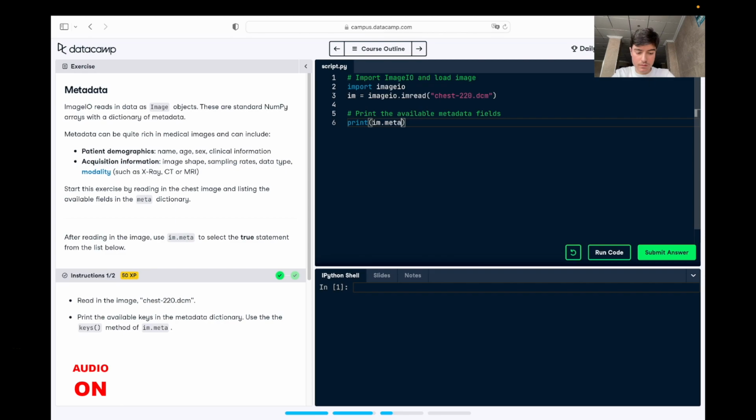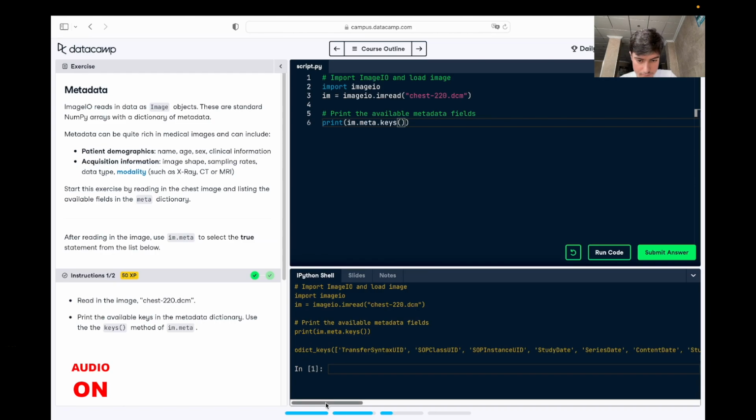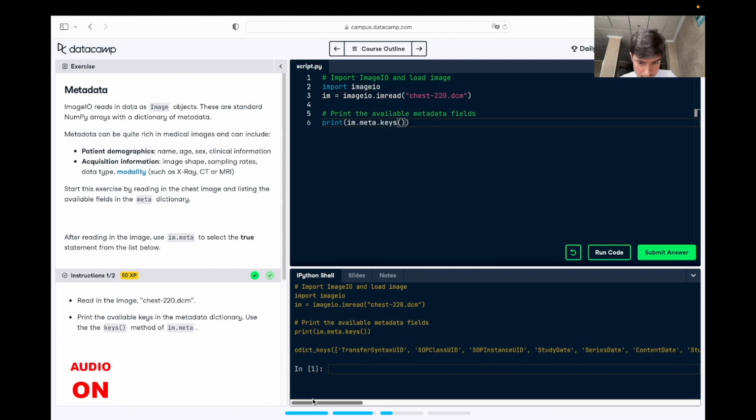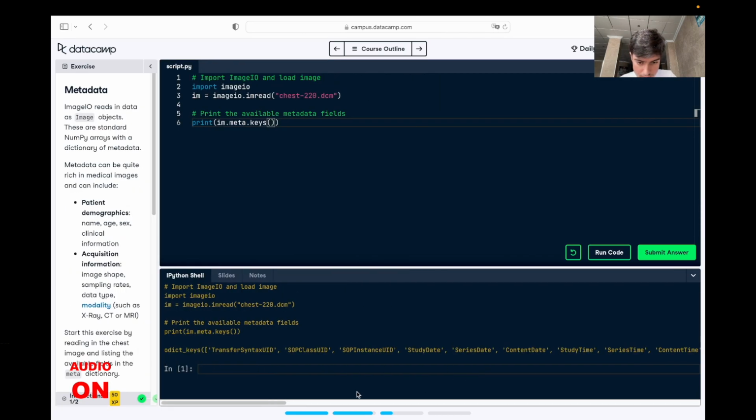The im.meta.keys function in the Python image library returns a list of the keys in an image metadata dictionary. Metadata is additional information stored along the image that can include details such as file format, resolution, color space, creation date, and more. It's useful when you want to access specific metadata information in an image to perform some additional processing or analysis.